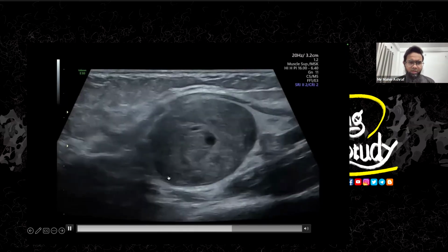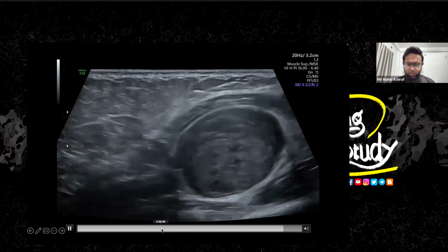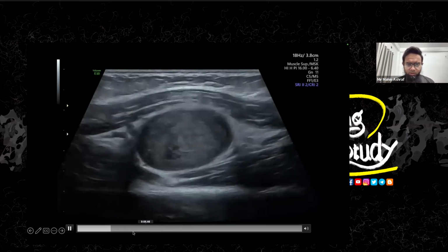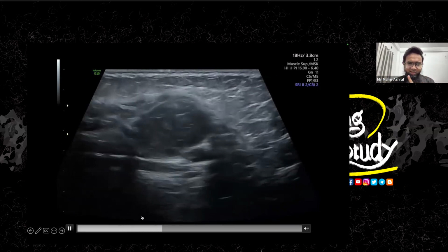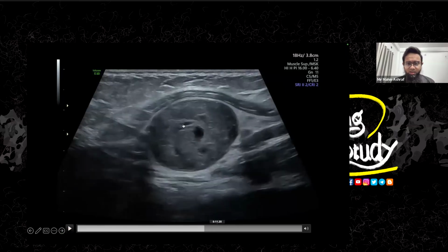But if you look carefully, just let me freeze the structure at a point. I think that will be beneficial. Okay. You need to search for the exact moment, actually. Yeah, we can freeze it here. So you can see, not at this part, it's not well understandable, but at this part, you can see there is a tapering end here.